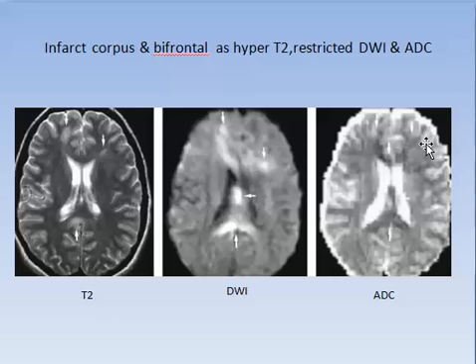So minimal bifrontal and mainly corpus callosum, and minimal anterior genu of the corpus callosum, but most of the others are penumbra. So most of the edema surrounding the lesions is penumbra. The difference between diffusion and ADC map: core and penumbra, core only.